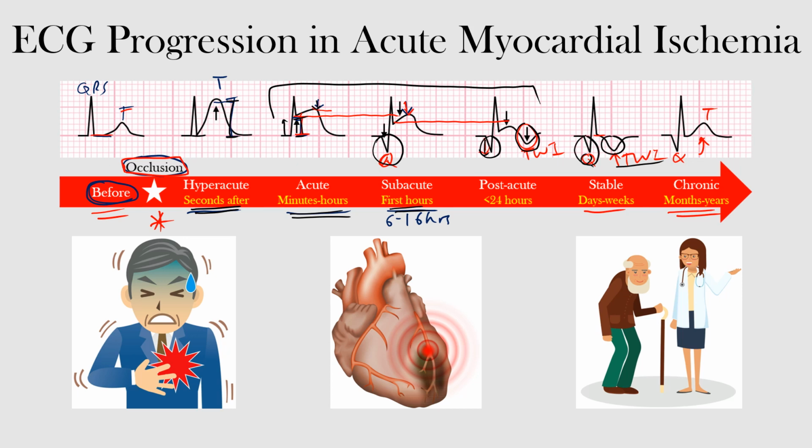And in the chronic phase, the Q waves are still there, and they can help us indicate and localize where the infarction is actually located. And then the T waves may either remain inverted or oftentimes will come back to the upright position, okay? And again, if the T wave inversions last longer than a year, we call those chronic, okay? Remember, that's where we get that post-ischemic T wave inversion, okay?